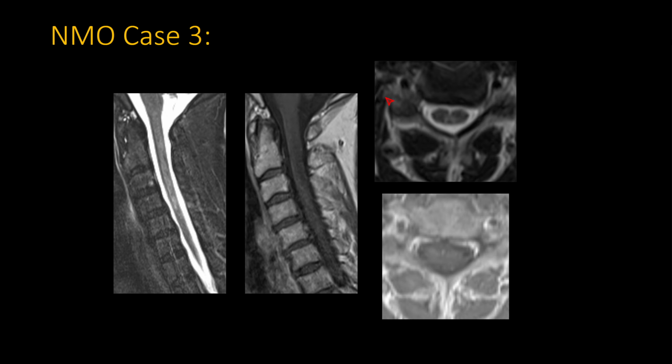Over time, that hyperintensity tends to start to resolve, and then you end up with these very patchy areas of signal abnormality that mimic MS. So in the chronic phases where NMO is no longer active, the hyperintensity can start to disappear, and as it disappears, it can look quite patchy, like a bunch of small lesions, like you would see in MS. That being said, if you have an active and acute episode of myelitis, NMO will pretty much almost always be longitudinally extensive.